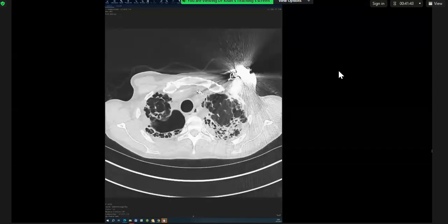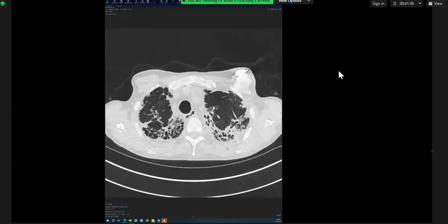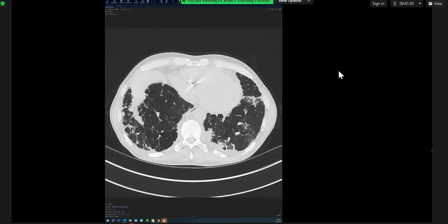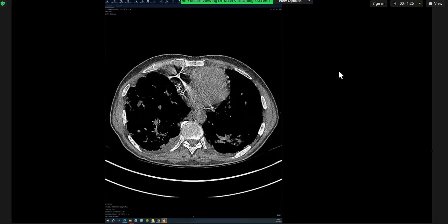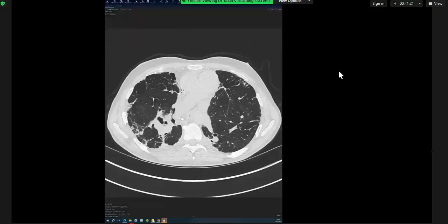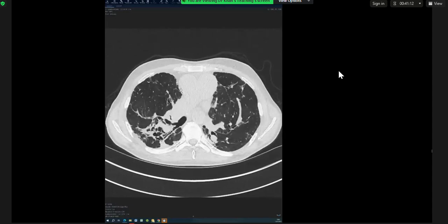So you have a pattern of fibrosis that's quite typical for a disease. This is a posterior pulling of the bronchi. It's almost like somebody standing behind the patient and pulling the lung backwards. It's very typical for stage 4 sarcoidosis. And by stage 4, lymphadenopathy has usually resolved and you have a bit of calcification left. But the pattern of fibrosis, the posterior one, is quite typical for sarcoid. And if you see that, the expectation would be to think down the sarcoidosis route pretty quickly.